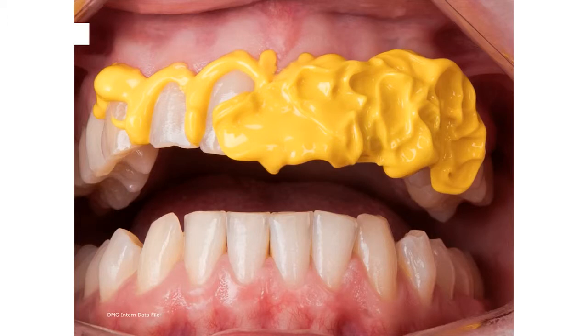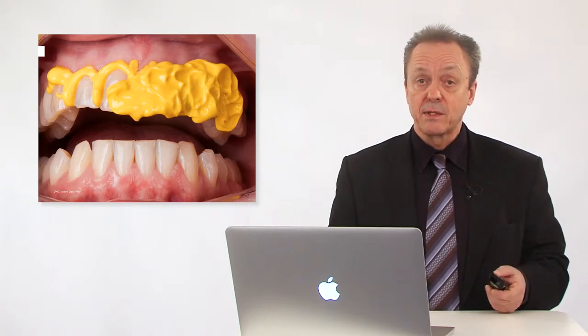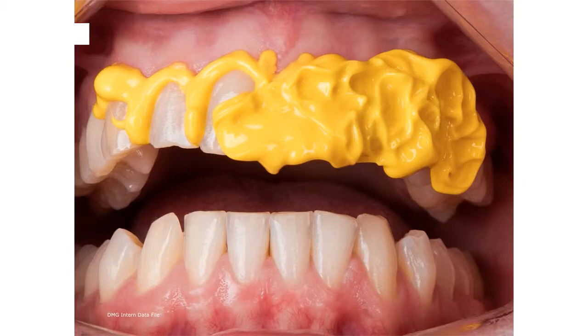On the right side, where the airstream strikes the material, as you can see here in the picture, you can clearly see real waves in the material, but only in the exact spot where the force of the airflow strikes the material. It's flowable. On the left side, where there's no shear force coming from the airstream, the material remains stable. It does what you want. The rheologically active matrix causes the property of Honigum Pro Light, outstanding stability and unique flowability in one material.